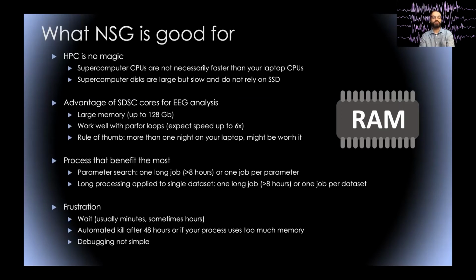Also, you'll soon see that if you ask for too much memory, your job is automatically killed. That happens often. You just require too much memory and your job gets killed, and so you wasted a couple of hours just submitting the job. And also debugging is not simple because you're not interacting directly with the MATLAB command line.